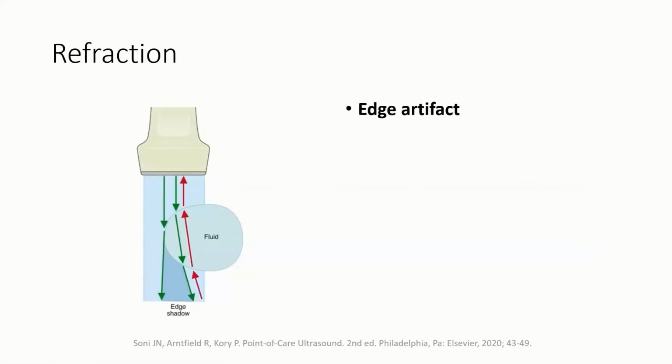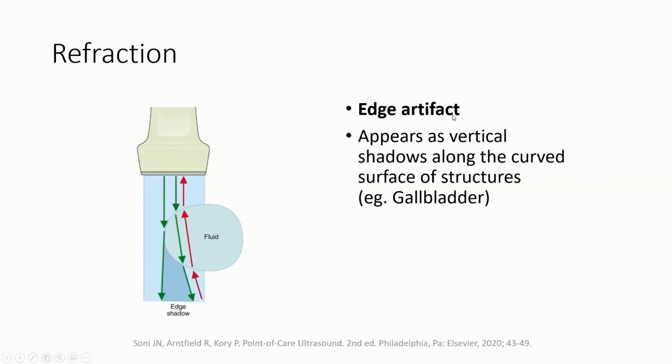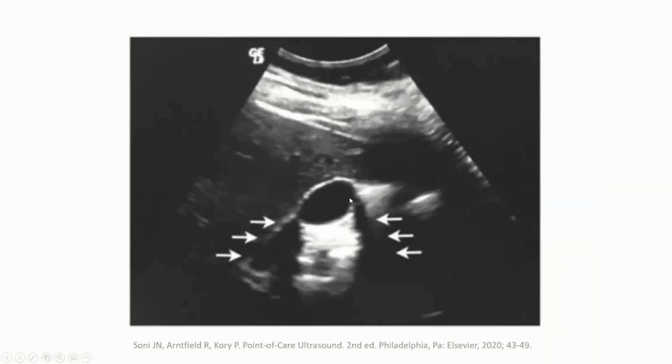Refraction is caused because the ultrasound wave refracts when it goes through different media, causing these dark shadows here, which are called edge shadow or edge artifact.